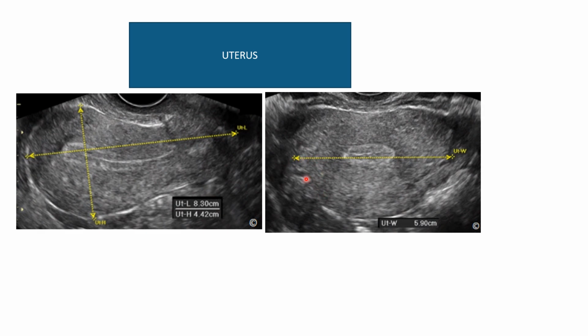If you remember the ultrasound physics that we talked about, we say that a high frequency transducer gives higher resolution, but it has limited penetration depth. So masses which are further away from the uterus, you need to assess using a transabdominal. In the preparation for a transabdominal, the patient must have a full bladder, but for a transvaginal, a patient must have an empty bladder. So here are the images that you are supposed to present and make an assessment of.